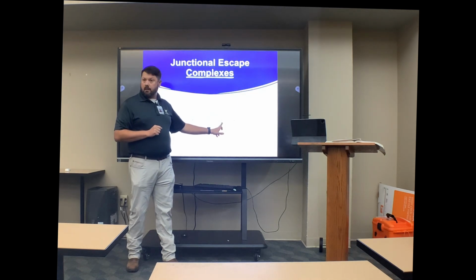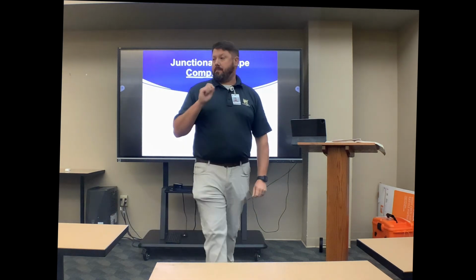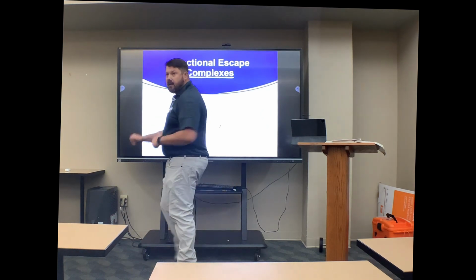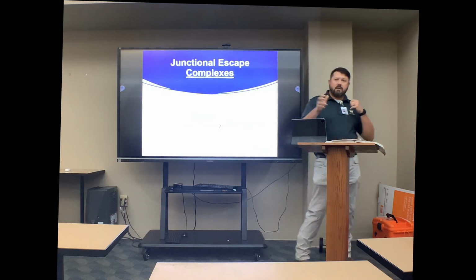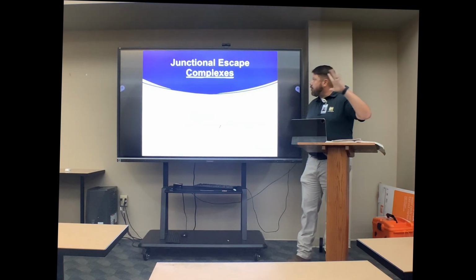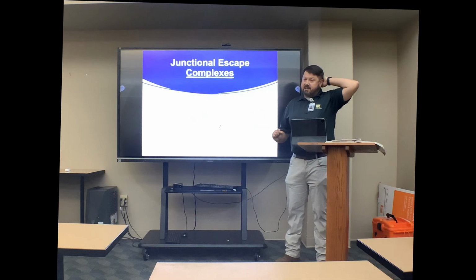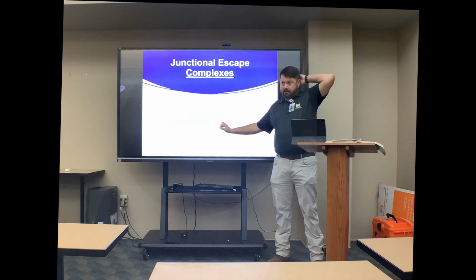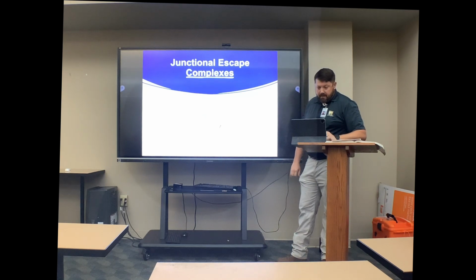Well, when does this occur? After my next expected beat. So this is a junctional escape beat. What basically is happening here is that the AV node is gearing up, ready, and it's like, should I pace, should I not? Something's going on here, right? So the rules for a junctional escape complex are the same as PJC, except instead of occurring before your next expected beat, it occurs after your next expected beat. Okay? That's really all we're going to see with the junctional escape beat right now.